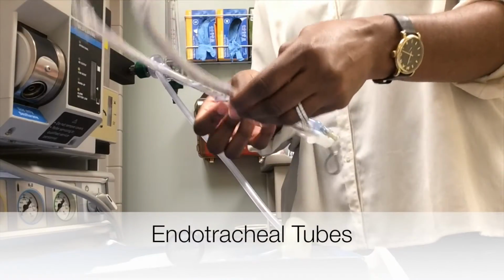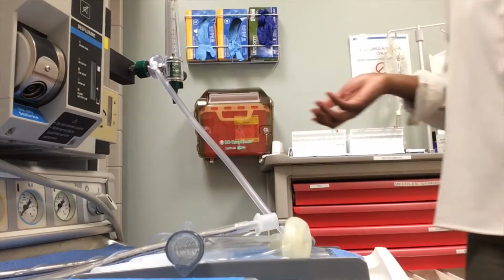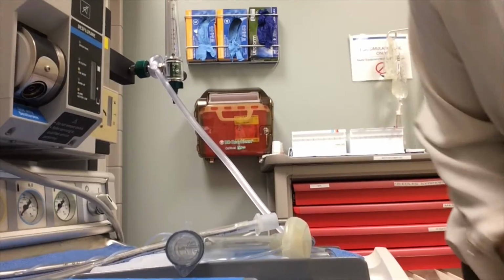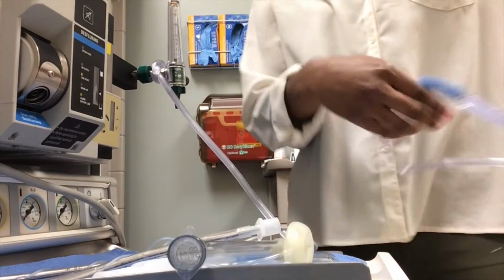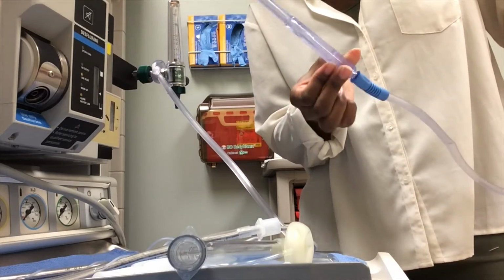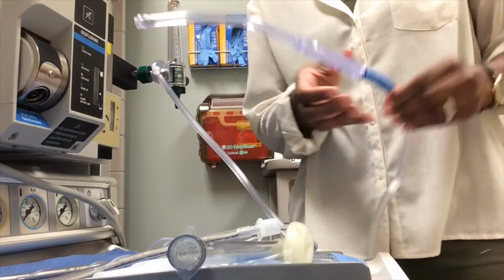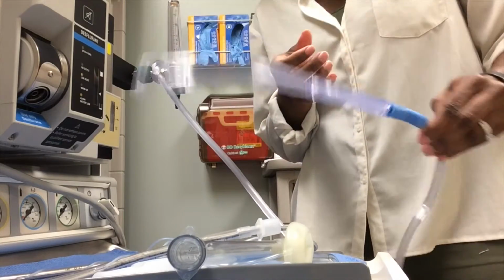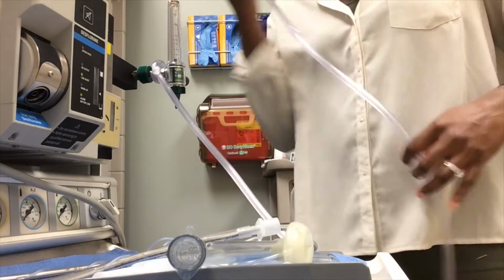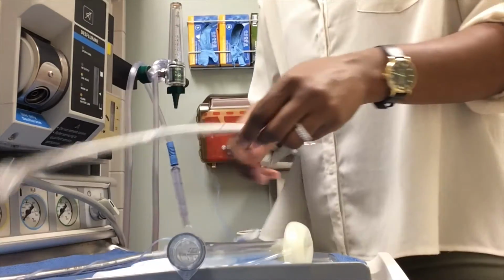ET tubes, these ones a lot of people are familiar with. If you look at some shows on Lifetime, they use these as an ET tube and have them sticking out of their mouth. This is actually a Yankauer. Actually, I don't know exactly how you're supposed to pronounce it, honestly. And they have this sticking out someone's mouth, and this is not an ET tube. It's a suction. Anywho, back to the ET tube.